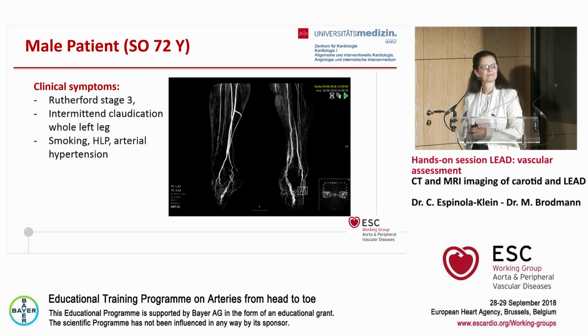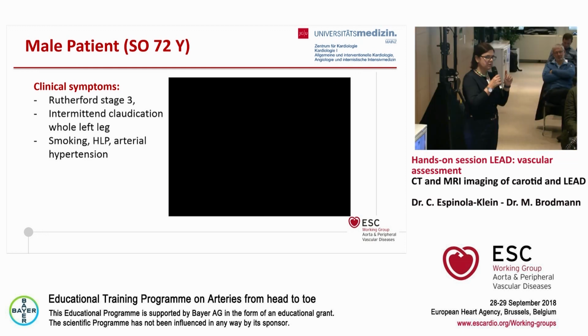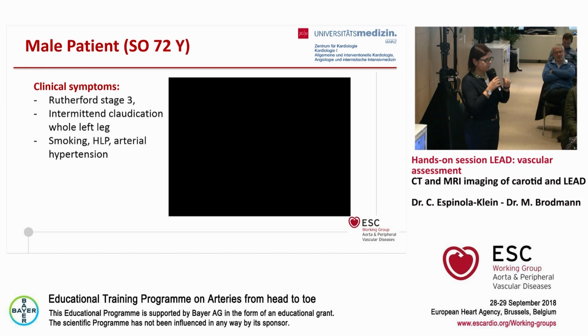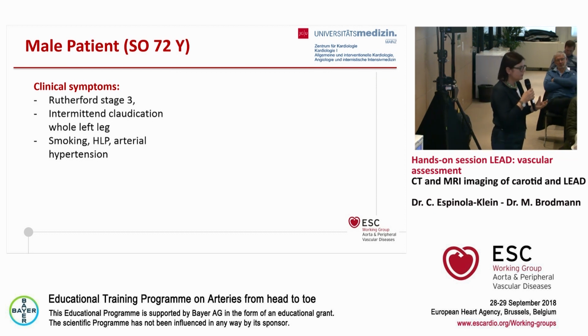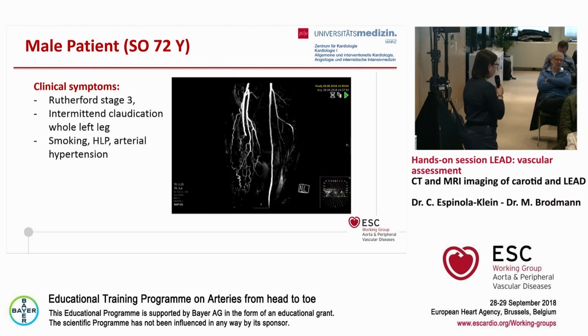And I think one argument, which we have seen quite nicely, is the good and thick collaterals on the right side. So if we have fixed the left one, maybe the patient will not have lifestyle-limiting claudication or a severe claudication, and he might go for exercise training.